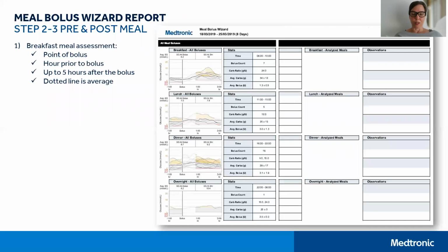Our third report allows us to assess step 2 and 3 of our CareLink 3-step methodology. This is the Meal Bolus Wizard report.